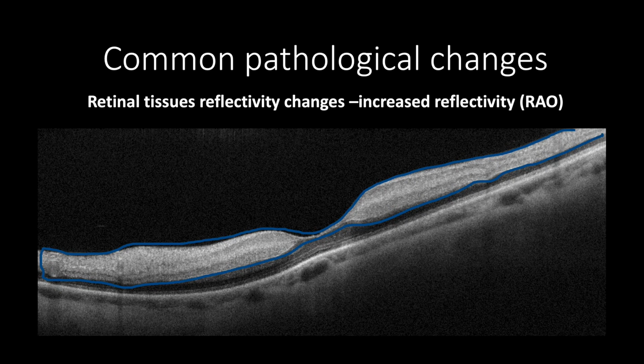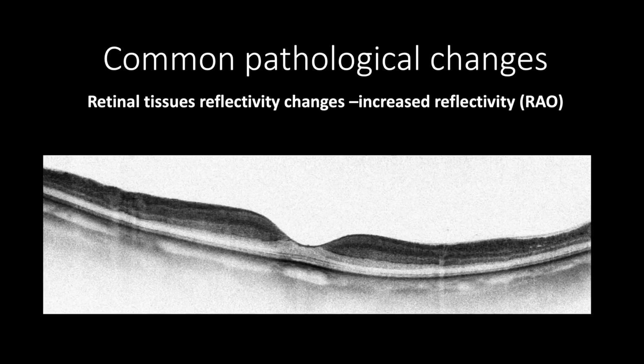This is due to the retinal artery reaching the inner nuclear layer, causing ischemic changes to the inner nuclear layer and other inner retinal layers. If there is a doubt about the status of the increased reflectivity, then OCT cross-section can be evaluated using negative black and white, as increased hyperreflectivity tissue will appear as increased shades of black.